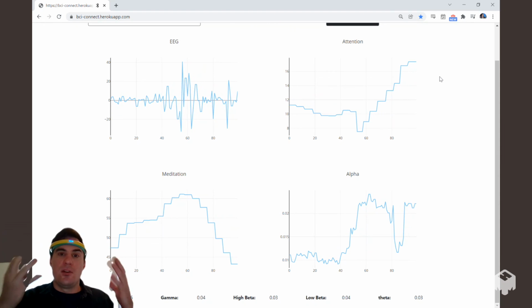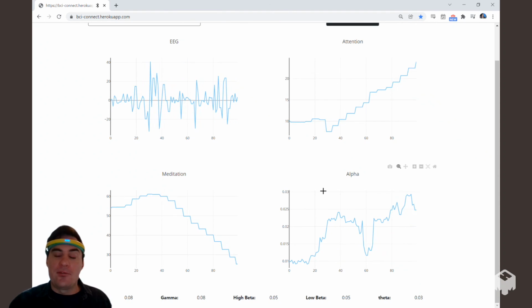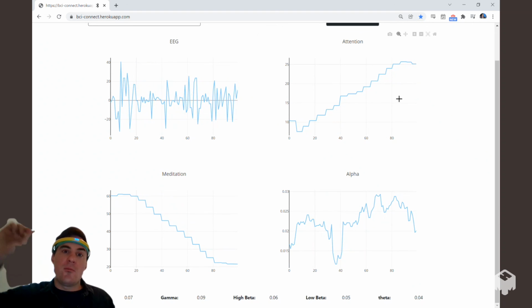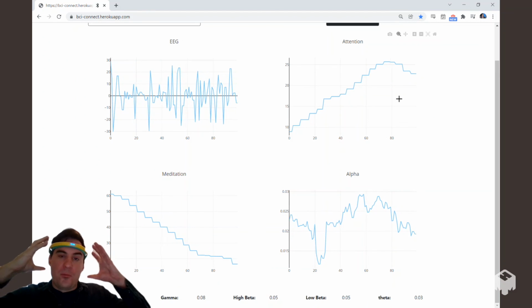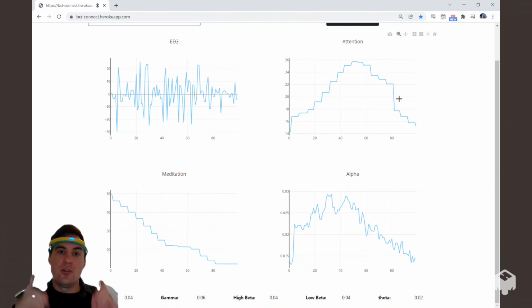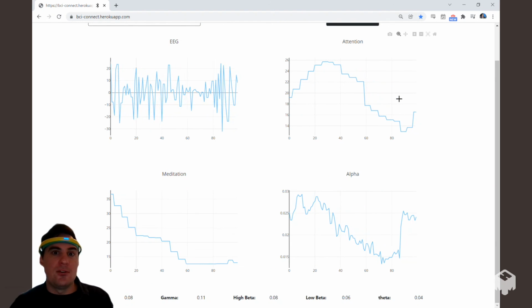And that is because the brain waves that are coming from my brain, remember, we could control our alpha waves a little bit. We could understand where this electricity came from. These are slowly coming back up because my brain is giving off different signals that we can measure with this headband and go to your Chrome browser on your Chromebooks. So that is just a small piece of what we can do with all of this.